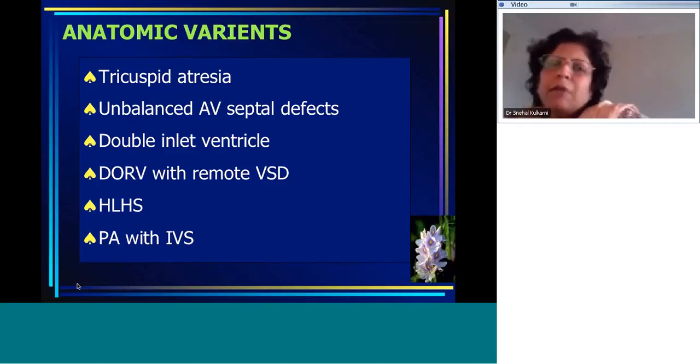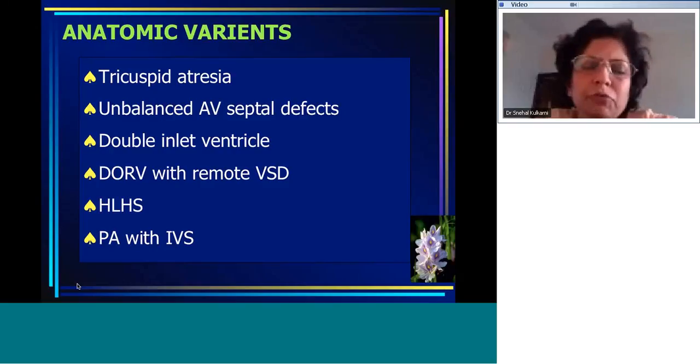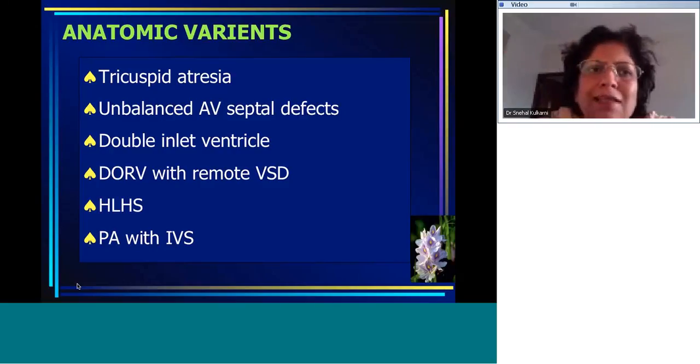When we call it tricuspid valve hypoplasia, you know that we have to take the tricuspid valve annulus and calculate the z-scores. When your tricuspid valve z-score is less than -4, that ventricle, that is an anatomic right ventricle, is never considered suitable for a biventricular repair.